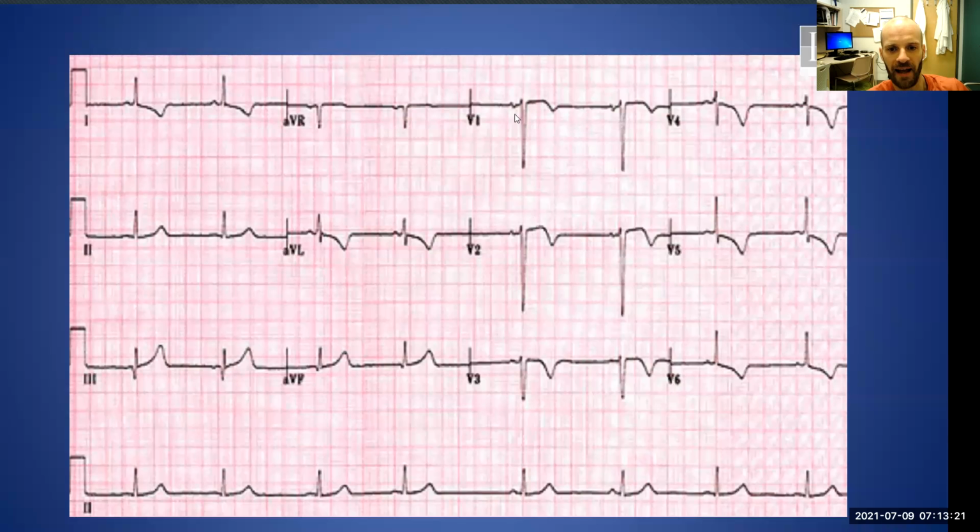they're pretty subtle anteriorly, and so this could be some ST elevation here, or this could represent a non-ST elevation MI. But you're certainly right that in leads V1 to V6, 1 and AVL, we certainly have marked T wave inversion. I think I'd probably call it anterolateral rather than inferolateral, but I think otherwise you've got it absolutely right. The heart rate's pretty slow. And what do you think the rhythm is?